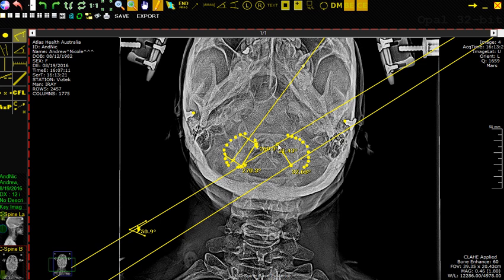So we need to find the midway point between anterior 1 and the midway point between anterior 2. Now I can do it the exact same way as I did before using the center point rule, or I discovered this, it's a podiatry tool, it's called the intermetatarsal angle. This only works if I actually draw the convergence angle on each side, but I will do it, so it's going to overlap with this line right here, just to show you what it's actually doing and how it works.